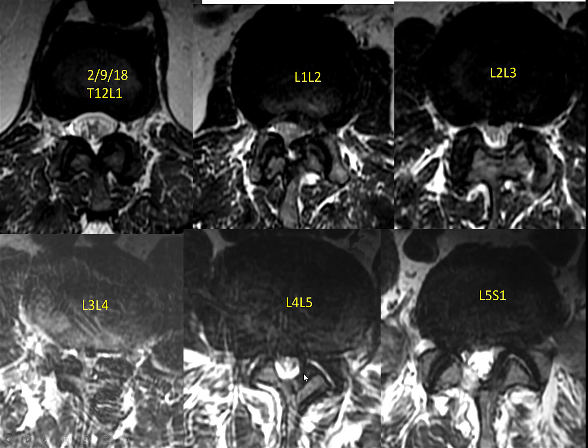4-5 is not too bad, right? You do see CSF, and 5-1's always been normal. So he has recurrent stenosis. It looks like his worst level is 3-4. 1-2 is pretty bad. So at this point now, what do you do? He's had the ULBD decompression.